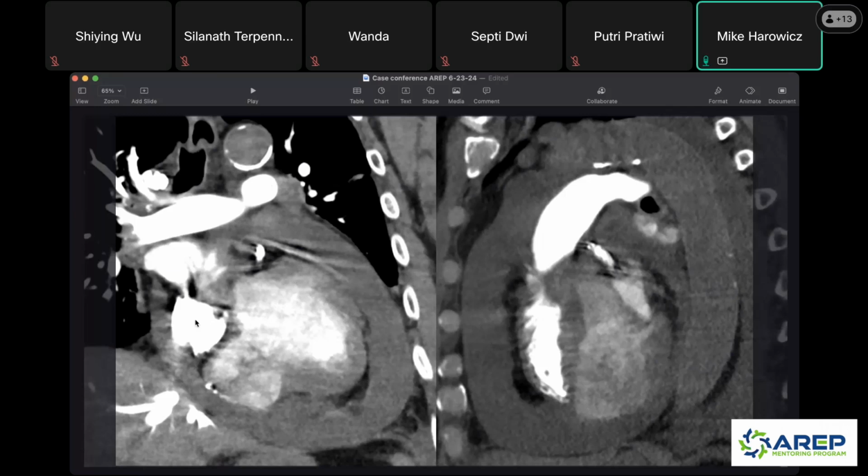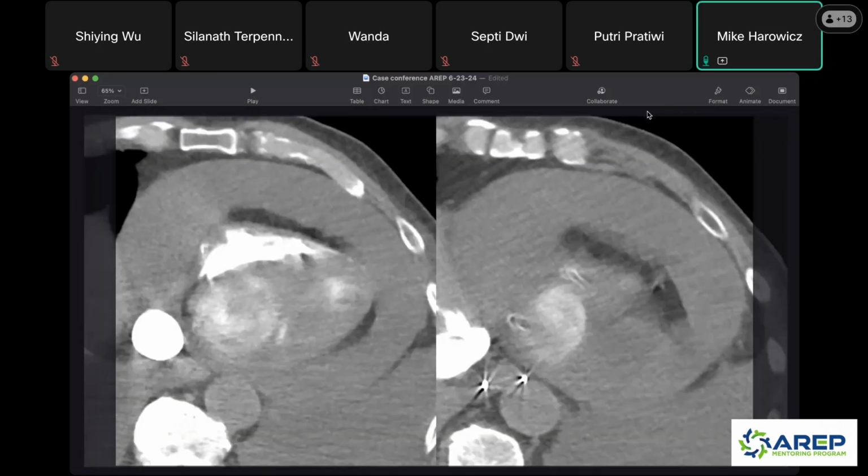This is probably part of your right atrium here, right? You can see the contrast density in your hepatic veins and your IVC is very similar to that. And what is this guy? So there's an outpouching here. It's going inferiorly, so it sort of lines up to that inferior thing that I was pointing out here.